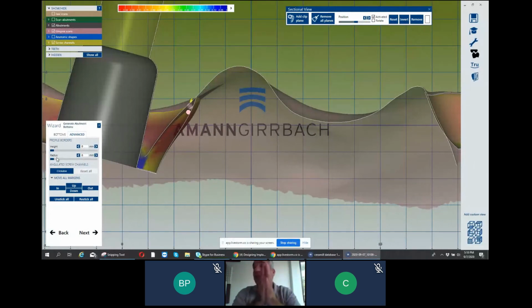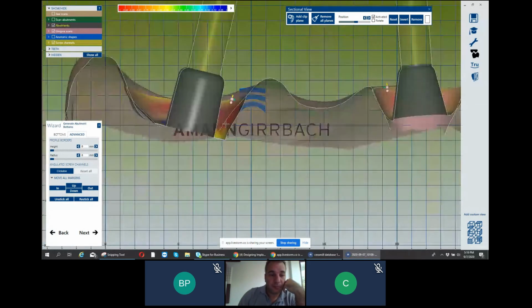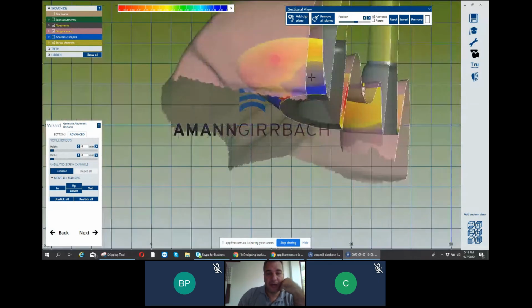In some cases, there is not enough space and the gingiva is so hard. So when the dentist needs to place the abutment in position, they have to push down or cut the gingiva, or will get more pressure on it, the patient will have more pain and in some cases it will not fit properly. So we prefer to reduce the radius. So now I have it bigger than the gingiva. Okay, here you can add material if you want to get it bigger to show you.